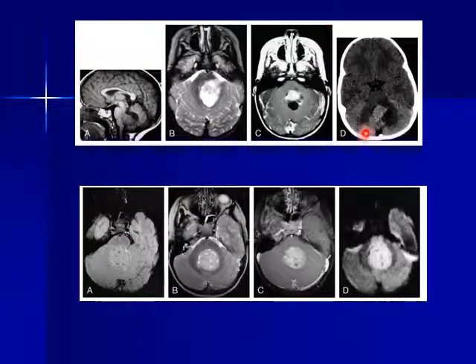Okay, these are examples of atypical teratoid rhabdoid tumor involving the fourth ventricle. Actually, it is more or less simulating medulloblastoma, but here the age. If you see a medulloblastoma-like tumor in the age below 3 years, you can put the differential diagnosis of medulloblastoma or atypical teratoid rhabdoid tumor. If the age is more than 3, put just medulloblastoma versus ependymoma, as I've told you.